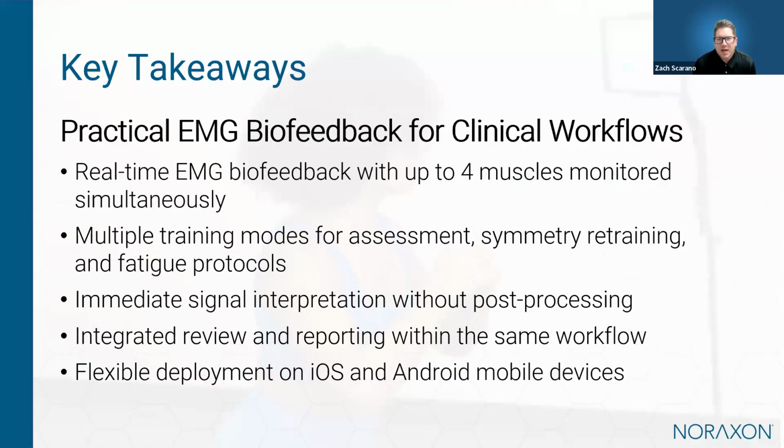Okay, so now that you've seen the Biofeedback app in action, I'd like to just briefly summarize a few key points. So the goal of this app is to make EMG biofeedback practical and easy to integrate into these everyday workflows. Clinicians can move from sensor setup to training to review and reporting, all within an easy to use mobile application.